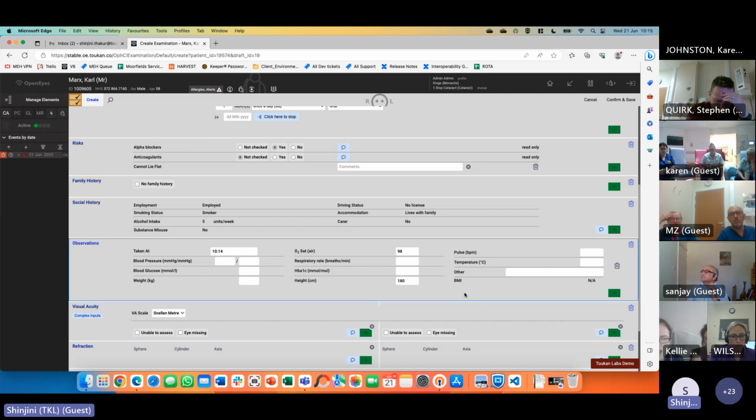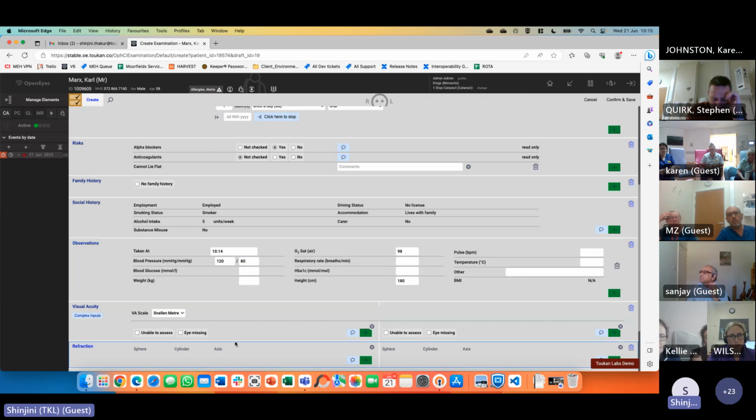No need to do all of them. You can do them every few minutes or once in the clinic, up to you. It depends on what you are recording. I could perhaps do a blood pressure, oxygen, and height, and that's it.